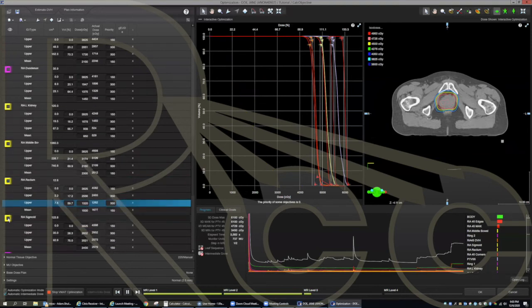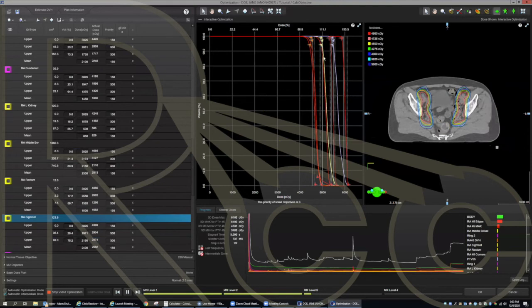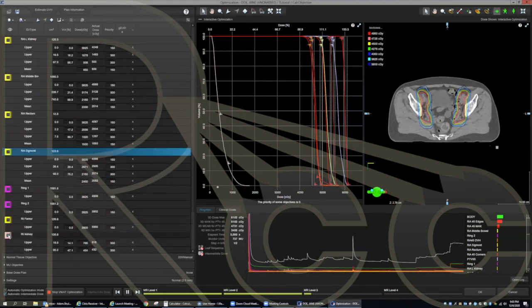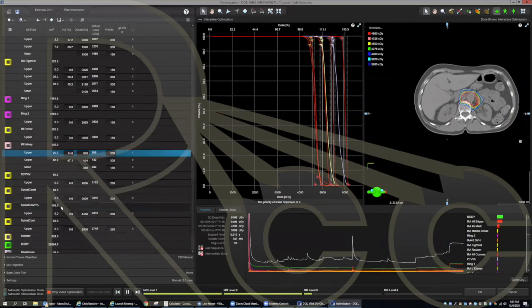It's a good example. Yeah, this is a good technique actually, because you can clearly see what is causing you the problems. Yeah, exactly. And you never really need a picture. You can only use DVH. By the DVH, yeah. And I think right from the beginning, when you have cases where, for example, there is a lot of overlap of bowel with the PTVs, you know that the bowel is going to be a problem. So yeah, you know that from the beginning.